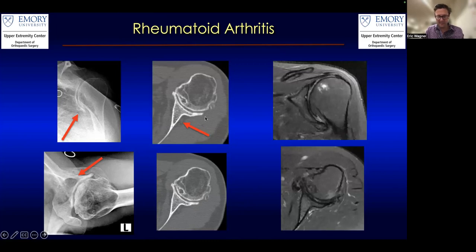I mean, there's no osteophytes. It's like flattening or medialization of this glenoid. And you can see there's no goat's beard here, even though there's so much bone that's missing. I mean, we're at the level of the base of the coracoid here. Patient's missing so much bone. There's no triangle because the whole triangle is being worn away.